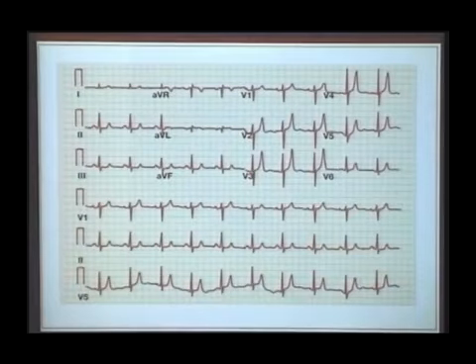Whereas look at this T wave. What's happening to the T wave? See the base, it's so narrow. See the apex, it's an arrowhead apex, so narrow and sharp. So whenever the tall T wave has got a narrow base with a very sharp apex, it is hyperkalemia. So this is hyperkalemia. You can see that very clearly.